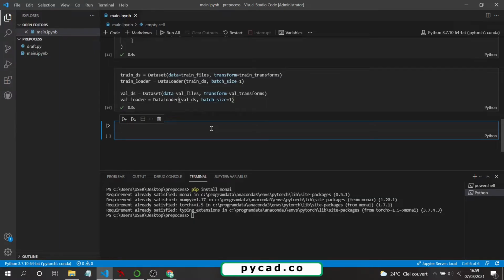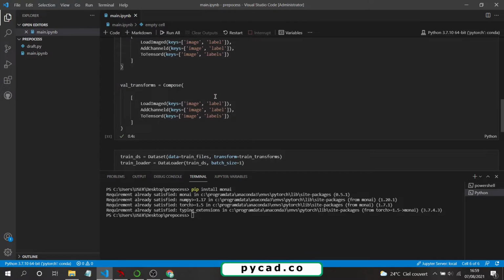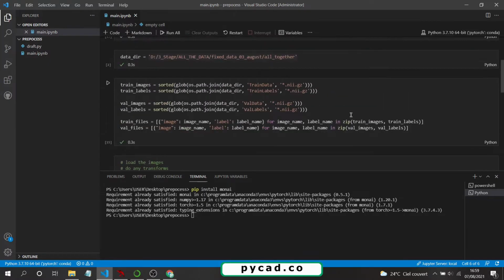Hi guys, so we will complete what we started in the last video. What we are doing is the pre-processing of medical imaging, but in volumes. What we did in the last video, we will just do a summary.